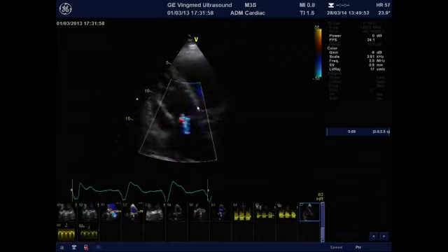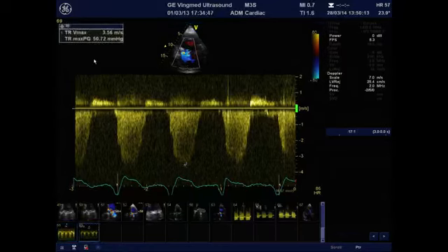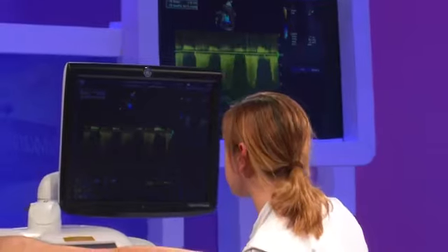Here you can see the septal movement first, which probably corresponds to severe pulmonary hypertension. Also, using the transtricuspid regurgitant jet, you can measure the transtricuspid gradient, and with the measure of the max velocity, you obtain a transtricuspid gradient of 51 millimeters of mercury, which corresponds to pulmonary hypertension.